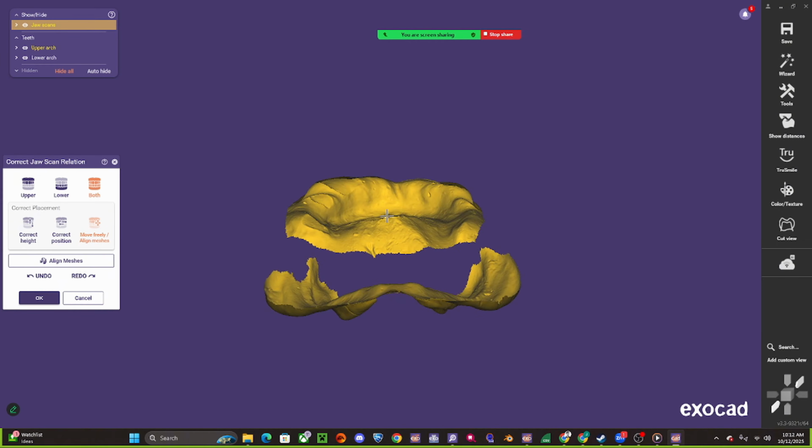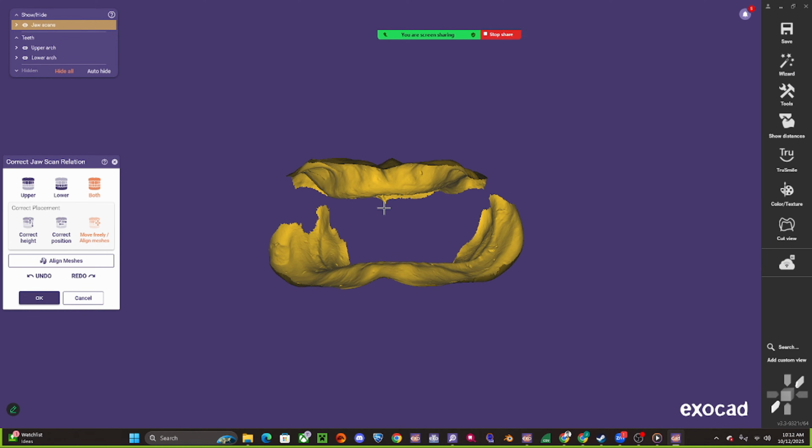Now you can use your denture base rim measurements, 18 and 22, right? But that's for a single arch. So if you're going to do double, you'll be somewhere around 40. But for some patients, 40 is a little too much. You don't want to have too much vertical height on these people. But you can always remove, which is the best part on that appointment. Dr. Omid could definitely talk about his experience when he's using these rims.